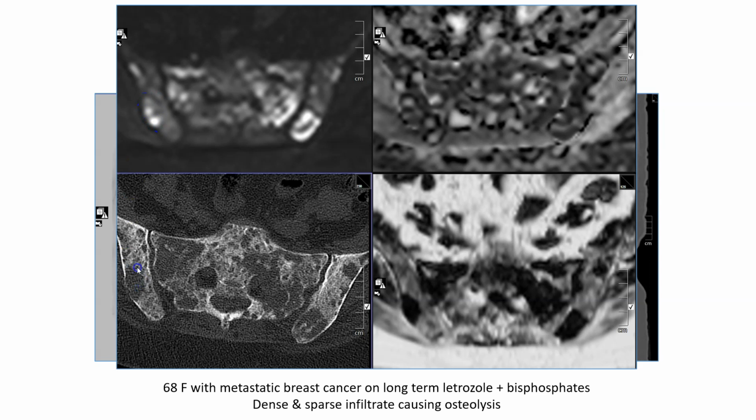So at the back here, you've got high cellularity. Elsewhere, you've got low cellularity. And in fact, you find the same thing happens over here. So look at this metastasis. You'll notice that it's highly cellular along the anterior margin at the back here, but there is less cellularity associated with this metastasis. And similarly, this metastasis here, which is osteolytic, has low cellularity.